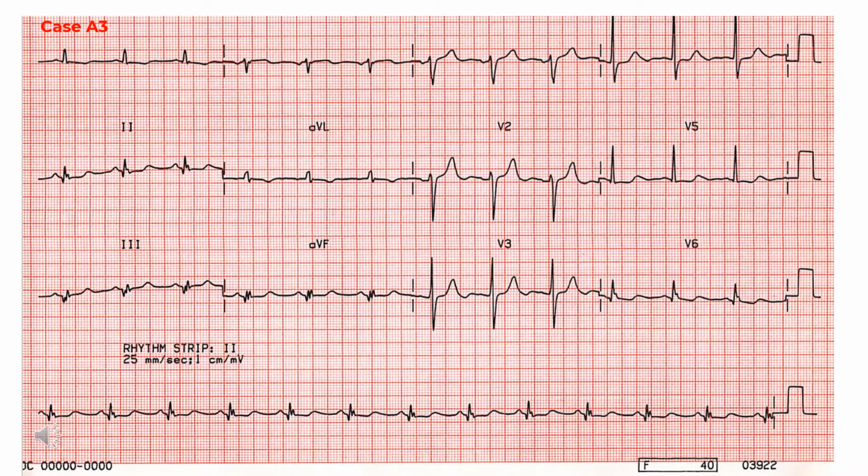The sagging ST segments and T wave changes in the lateral leads are non-specific changes but suggest ischemia in this area. No other explanation for these changes is apparent from the ECG, and the presence of old infarction provides clear evidence for the presence of ischemic heart disease in this patient.